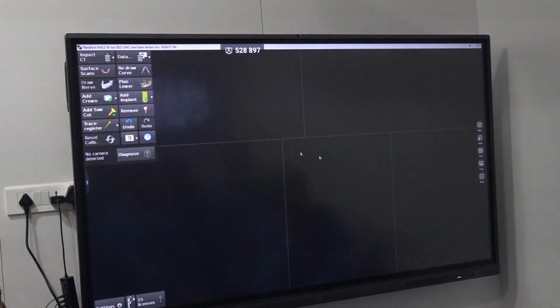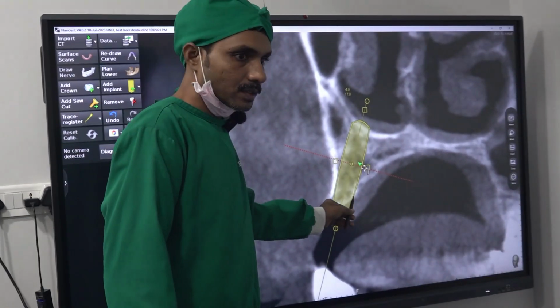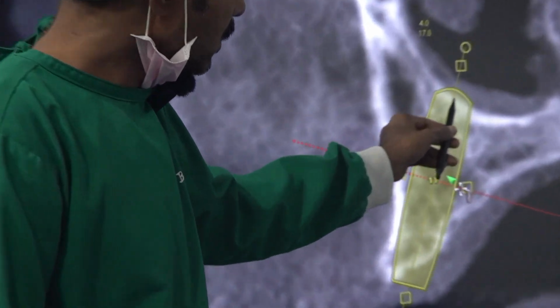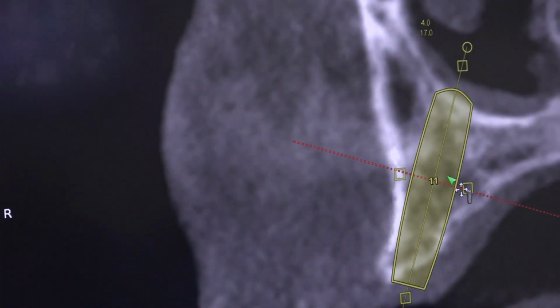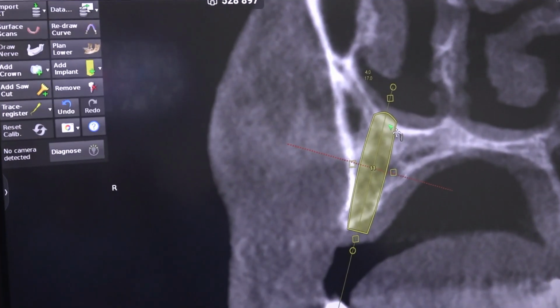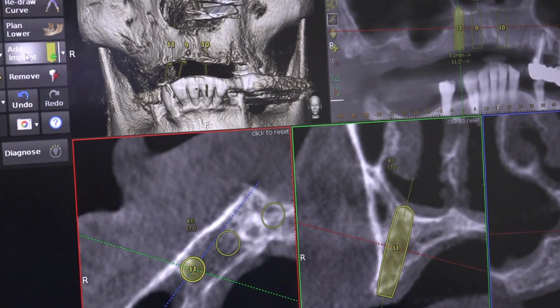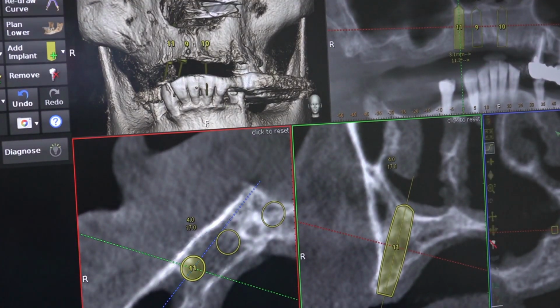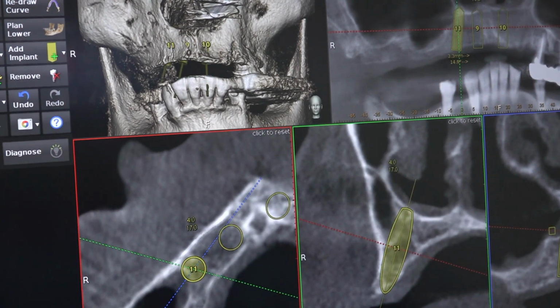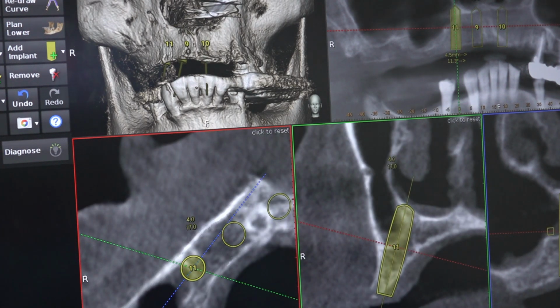We see the buccal in the cross section. So here also there is severe ridge resorption. Knife edge, we are going to do the bypass kind of thing. And nasal floor will save us. It is good stability. It is around 1100. So anteriorly 2 implants is enough. And one more plan is you can just slightly tilt mesially and go distally. Okay. This is just complicating the matters. We will place straight to straight.